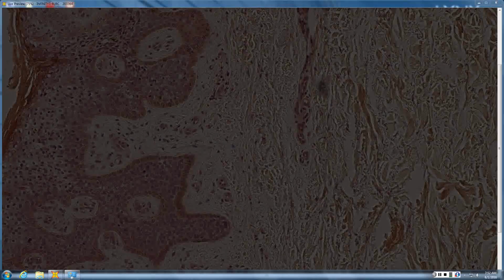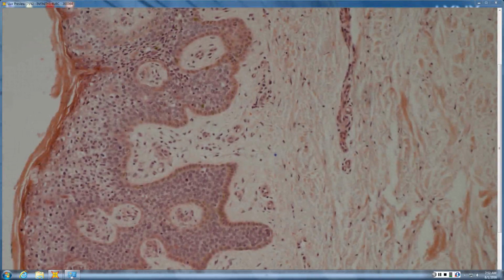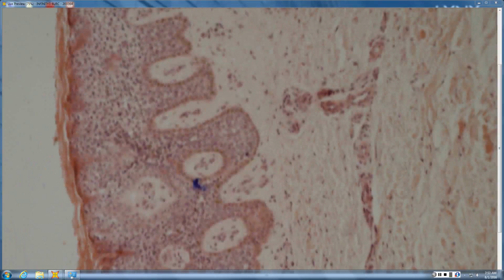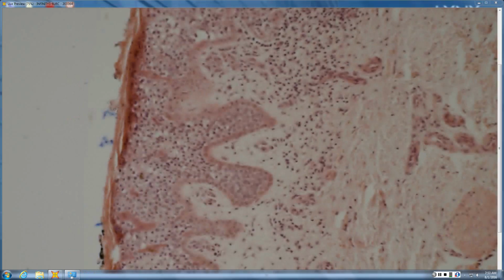So you have some clear cell change in the epidermis, some crowding, sort of bowenoid. How about your basal layer? It looks like there's a lot of crowding and sort of palisading around. Yeah. So what you've got here is kind of an eyeliner sign, where you have a normal basal layer that's crushed by the expanding proliferation of clear cells.